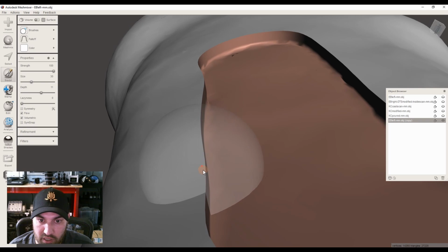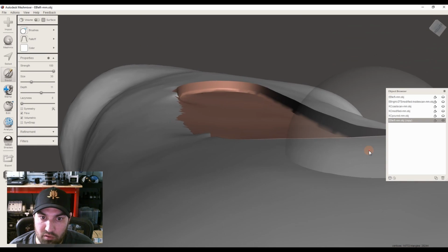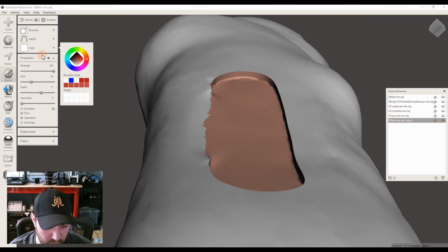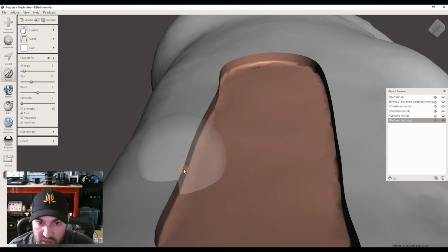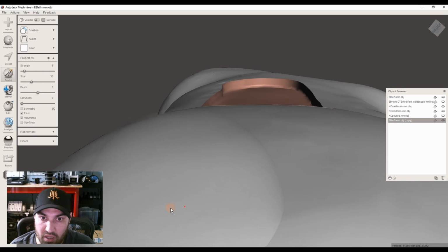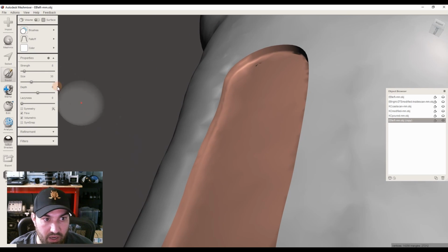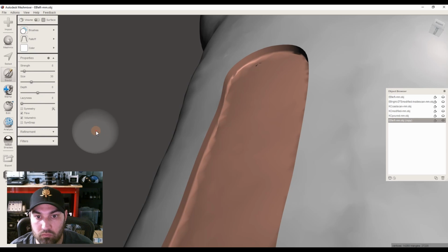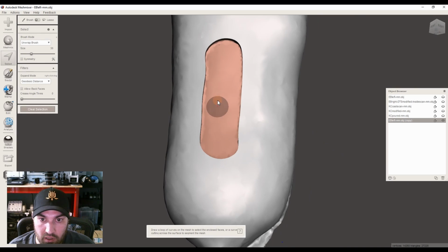And if we did a shrink, that's actually going to cut down from your top edge. And the robust. Sometimes the robust doesn't do a whole lot, depending on what you're working on and what your settings are. So that's one way we can do that.